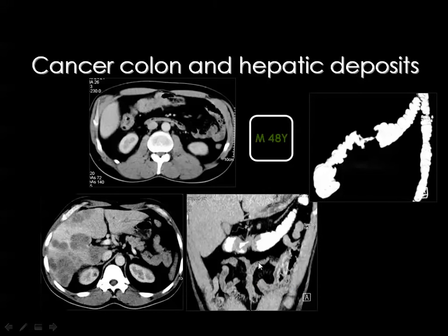Look at this case, a patient with carcinoma of the transverse colon, and we injected gastrografin per anus. Then we delineated the colon, and we have the scan, and we reconstructed the image so that you can easily appreciate the site of the lesion. And also you can order the scan to remove everything, leaving only the colon.